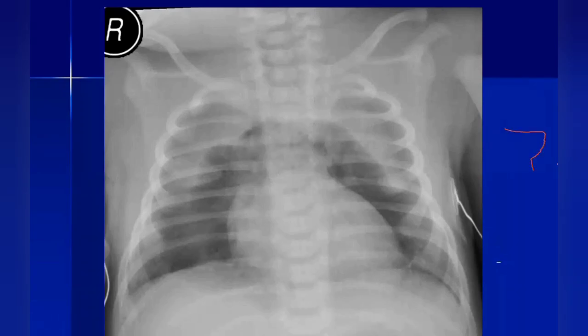Yeah, so this patient has extensive pneumomediastinum, which is elevating the thymic lobes, as you mentioned, and surrounding the lateral borders of the heart. The lungs have adequate volumes, but the patient is just after extubation, and this is probably due to positive pressure ventilation. So it needs to be recognized, although it's not as much of an emergency as pneumothorax or tension pneumothorax. Thank you so much. Right.